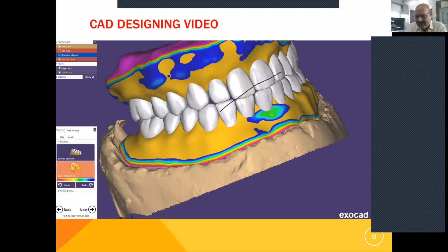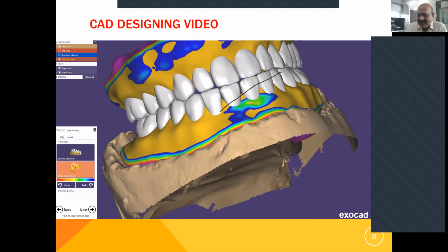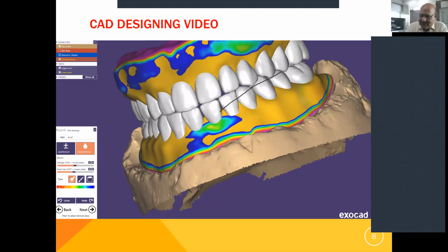Yes, that can also be very useful because many times if the jaw relation has not gone correct, I'm afraid very little we can do. But what we can do here is prepare the denture base, which in any case will not change. And then we can give a teeth trial, what we have done. Then in the mouth, trying can be done.